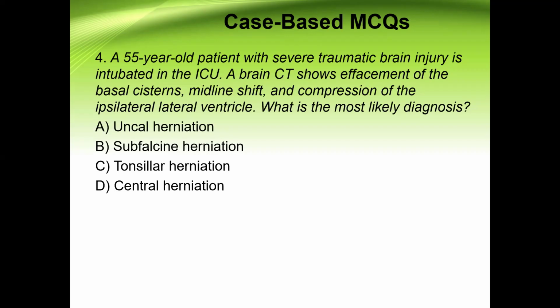Beautiful, correct answer. All right, and there's a midline shift. Which center are you from? I'm from Nelson Mandela in Mthatha, South Africa. All right, my South Africa people, correct.